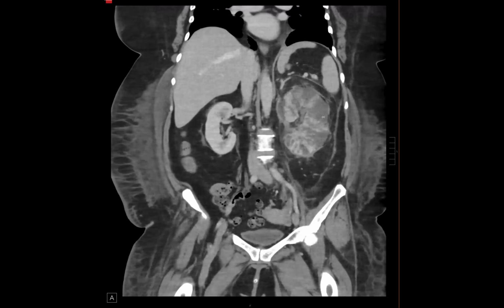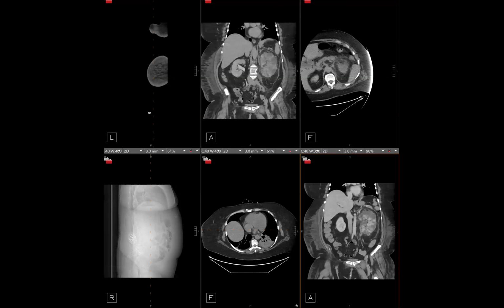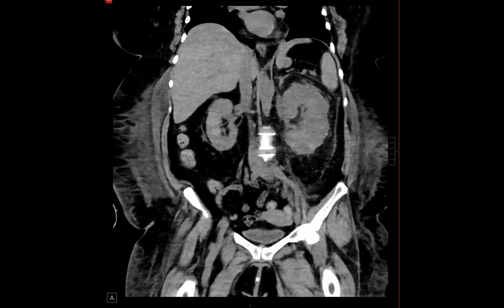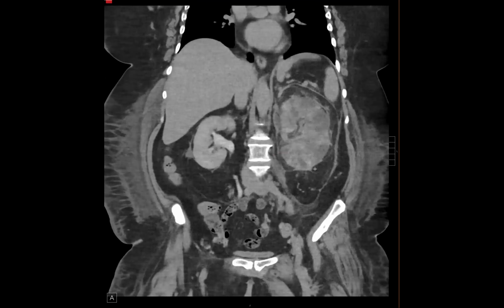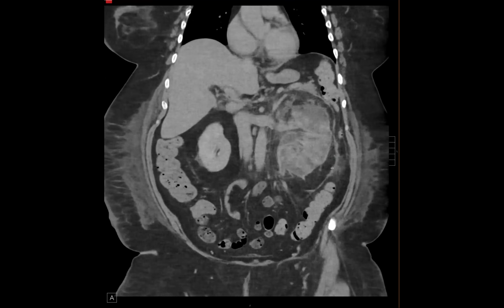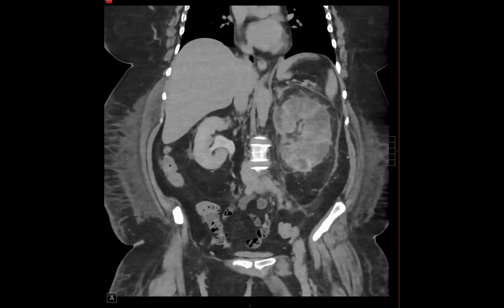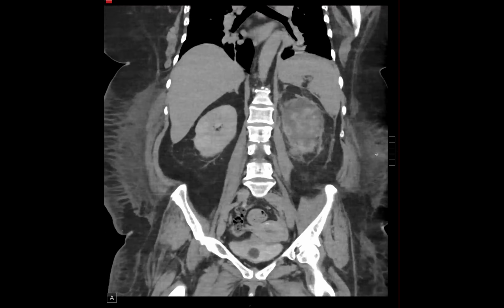I mean, I know I've definitely seen all of it, but there are areas where there's just frank non-enhancement, and on pre-contrast, it's dense, right? So right there, and I was thinking, could this be necrotizing pyelonephritis? The patient has significant risk factors, obviously, and was in septic shock, urosepsis.